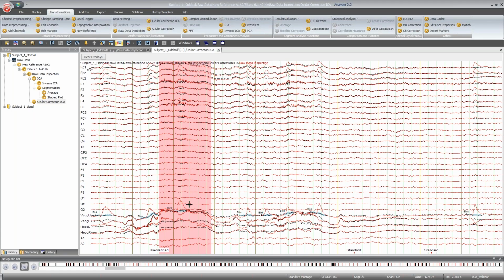The nice thing is, the data in the bad intervals might have been cleaned by ICA now actually here. So I could actually remove the bad interval now and then I get more data. So I would always recommend to check if the bad intervals still are over bad data, or if ICA maybe really cleaned the data, even though there was an artifact that was not used for the matrix computation.